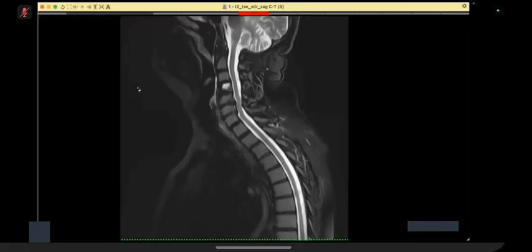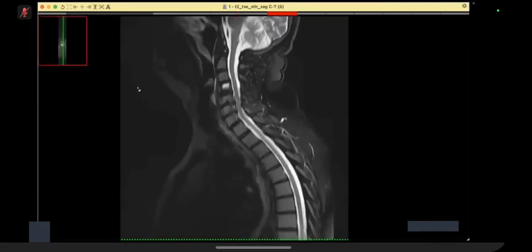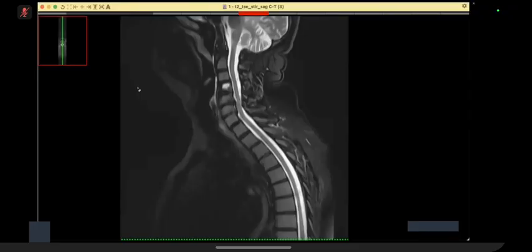In case there are diffusion weighted images available of the spine, I like to look at those also. But my impression would be marrow infiltrative pathology, like metastasis or myeloma. Or lymphoma. I don't see much soft tissue, but it can be a lymphoma also, in the third differential.